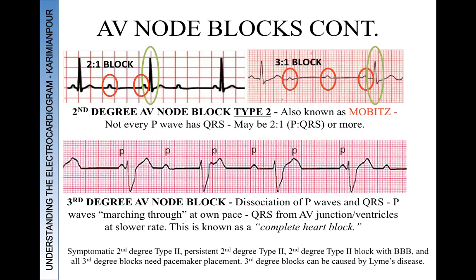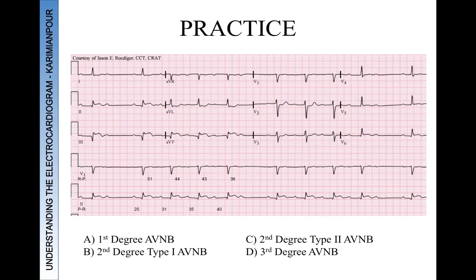If you're literally living off of your left posterior fascicle, and that's the only thing that's conducting electricity to the entire heart. So this is a practice. Let's pause the video here.